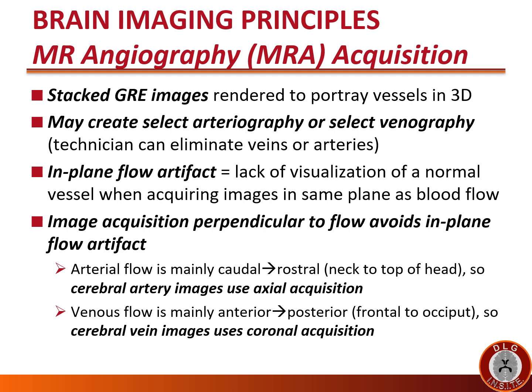One thing to be concerned about in interpreting MRAs is in-plane flow artifact. This is a lack of visualization of a normal vessel when acquiring images in the same plane as blood flow. The technicians should be aware that image acquisition should be obtained perpendicular to flow. This avoids in-plane flow artifact.